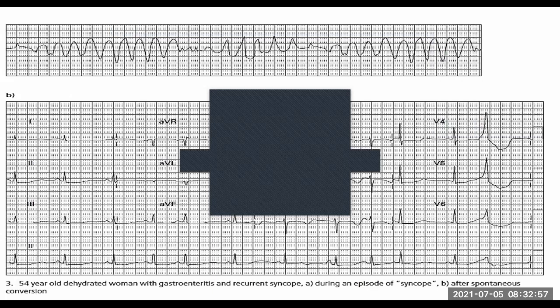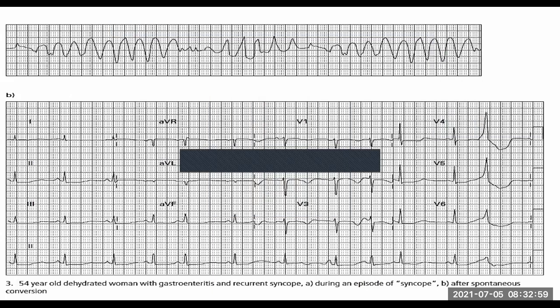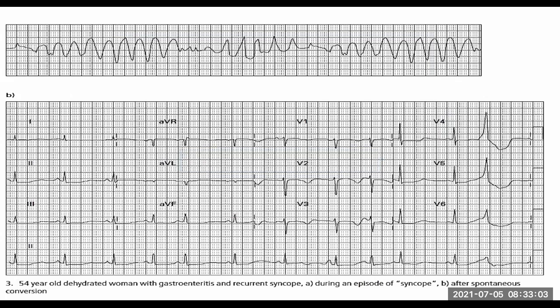All right. Okay. So one of the zones, like I say, is 2, 3, and AVF. So to give you an example of what that means, so like 3 of you are sitting there, and if I ask you to describe my face, you'll each give similar but not exact descriptions. Okay. As compared to him who's sitting right on that side, he's going to give a completely different description. So that's what we say when we analyze each zone. All right. So this is the inferior zone. It's 2, 3, and AVF.